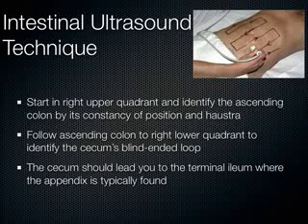That's how we can quickly decide between small bowel and large bowel on any imaging study, looking at haustra versus plicae circulares. That sounds like minutiae, but actually that comes into play quite a bit in most fields, so it's something you might want to remember.